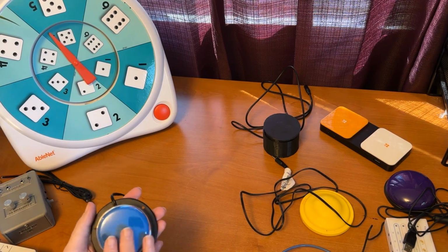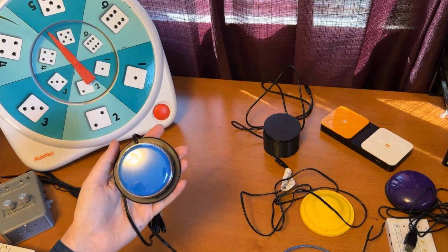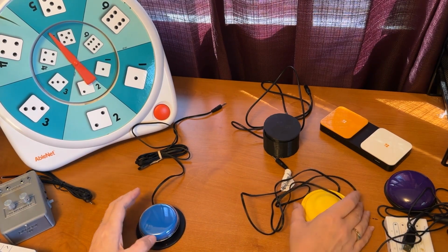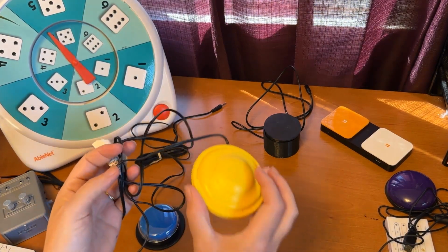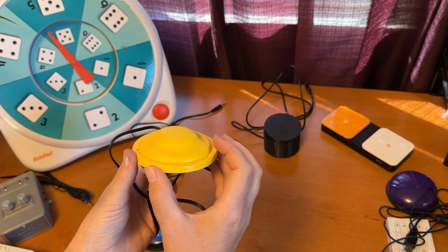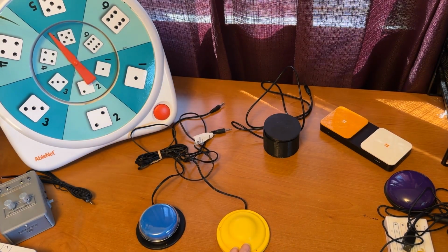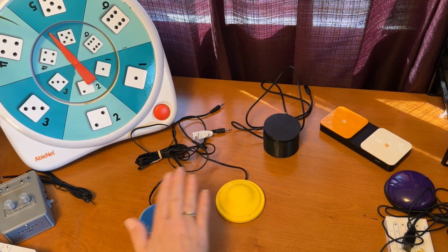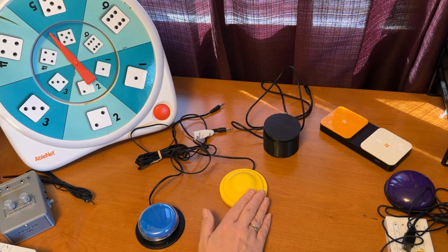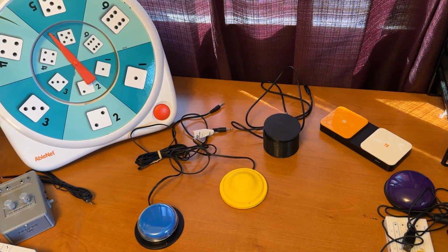There are also switches very similar in look to this, but bigger if the user needs a bigger surface area to be able to touch. Now, there are a variety of other switches that are very similar to this one. For example, there is this switch from Enabling Devices. It activates very similarly by pressing down. The difference with this one, you'll see, is the shape of this switch. So this switch is easier if you have a user that maybe can't get their hand all the way up over the top of the switch. This one can activate just by hitting the edge of it or coming at it from an angle. So again, these are both going to work very similarly just by pushing down.